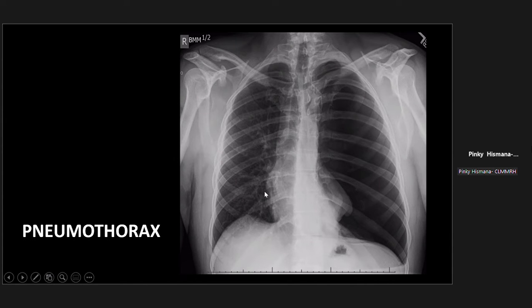One of the things we use to describe pneumothorax is a lucent or hyperlucent area, devoid, meaning there's an absence of pulmonary vascular markings. That means you don't have the lung parenchyma here. Though not all the time does absence of pulmonary vascular markings mean pneumothorax. We also have emphysema, wherein there is sparsity, or decreased pulmonary vascular markings. So this is actually a case of tension pneumothorax.